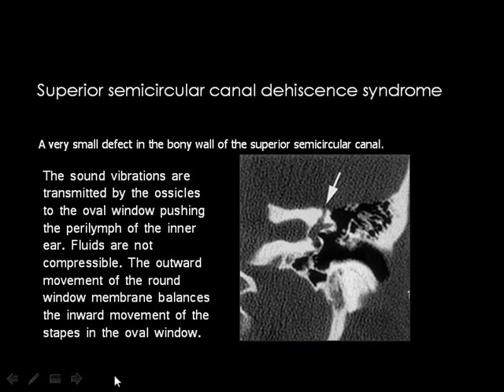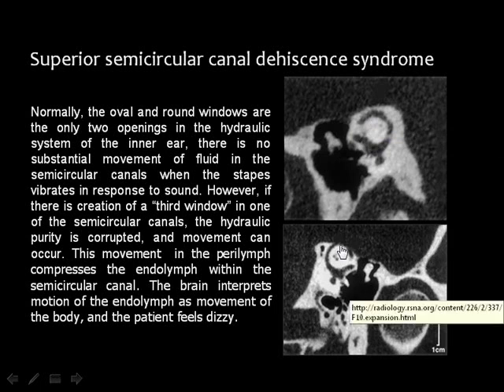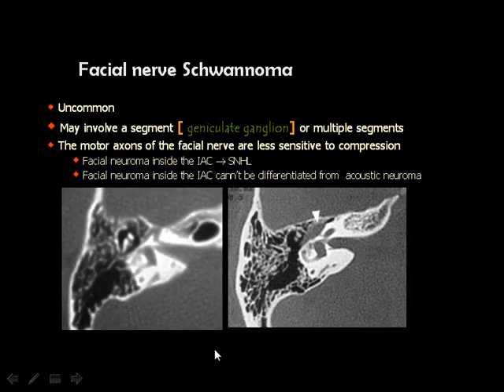Especially if he has this syndrome, okay. Then our role in diagnosis is just to look like this. We used to do, nowadays, if this is the possibility, special sections for the semicircular canal to see the whole superior semicircular canal. This is the oblique sagittal view, and you can see the whole superior semicircular canal. The upper part is dehiscent and is directly related to the brain.